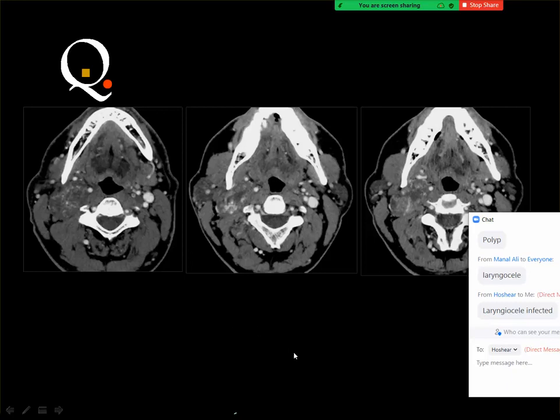And in order to know the diagnosis, you should locate the lesion in relation to the parapharyngeal fat. If it is lateral to the parapharyngeal fat, then you should mention part of the parotid gland. But if it is posterior to the fat, then you are in the differential diagnosis of glomus tumor and neurofibroma or schwannoma and lymph nodes.